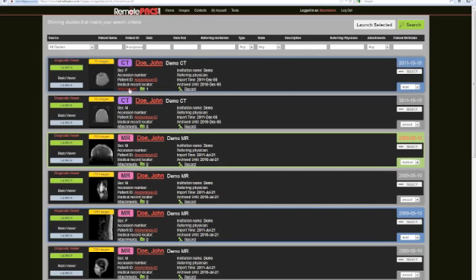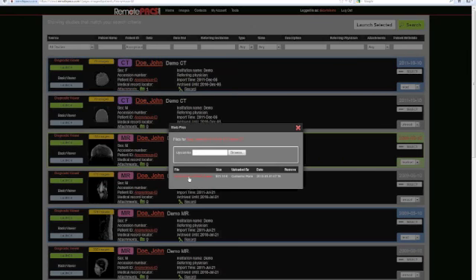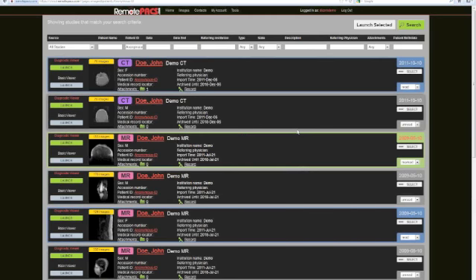The next feature that we give you is the ability to attach documents. So what you can see here, just by looking at the screen, is that this first study for John Doe has one attachment to it. But the one below it for the CT, also for John Doe, has 0 attachments. So if I click on it, I'll be able to open this WAV file and play it in whatever the native program is that opens it. You can add PDF documents, Word documents, text files, JPEG images, whatever you need to add, you can upload here. There's no additional charge for it. It's built right into the service.